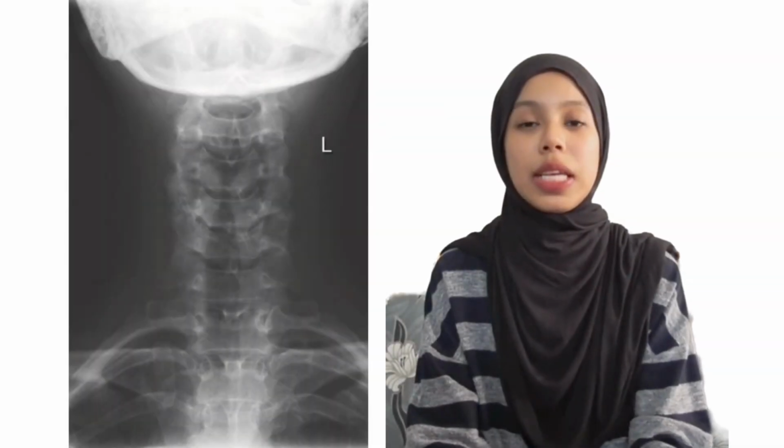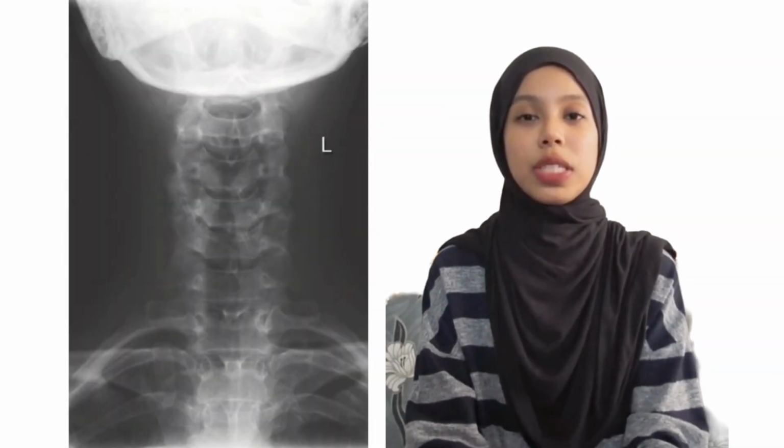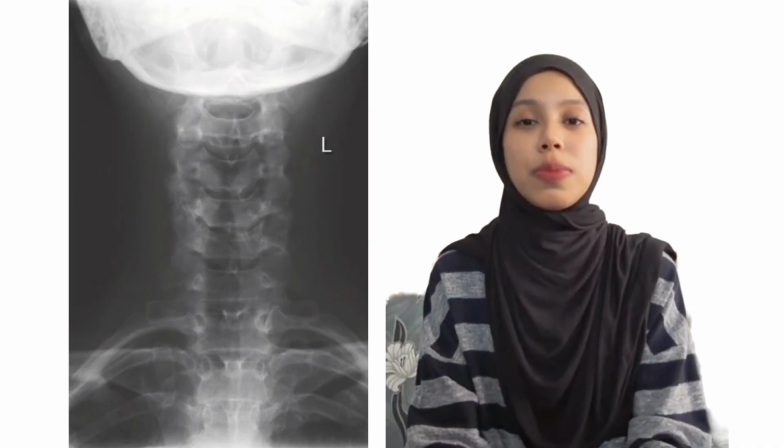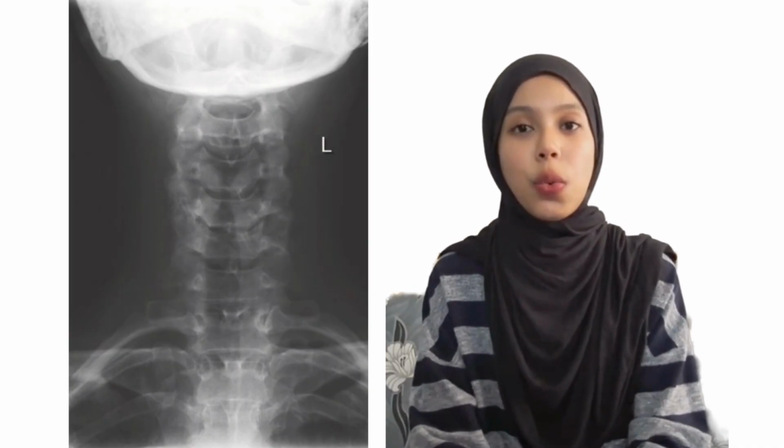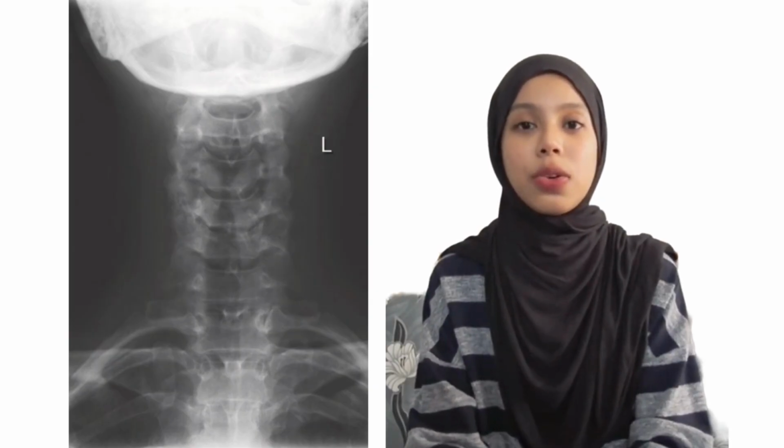Presence of anatomical marker seen in the radiograph. The placement is correct, with the letter L seen next to the cervical. The IR size used is 18 by 24, which is suitable to demonstrate all the structures of interest. There is no artifact seen on the radiograph.